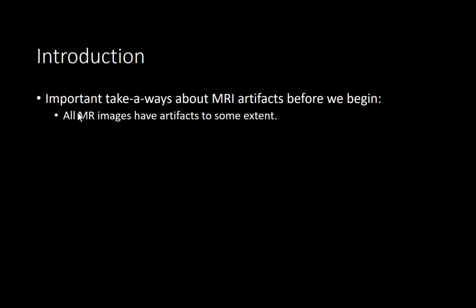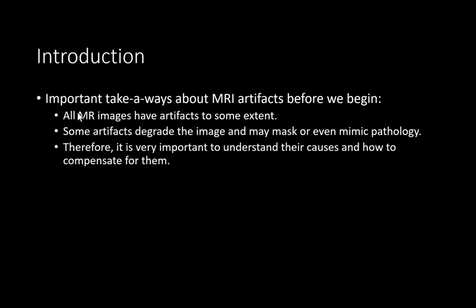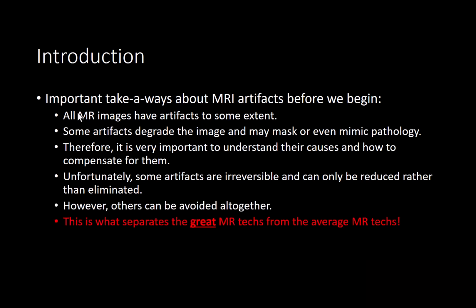All MR images have artifacts to some extent. Some artifacts degrade the image and may mask or even mimic pathology. Therefore, it is very important to understand their causes and how to compensate for them. Unfortunately, some artifacts are irreversible and can only be reduced rather than eliminated. However, others can be avoided altogether. This is what separates the great MR techs from the average MR techs.